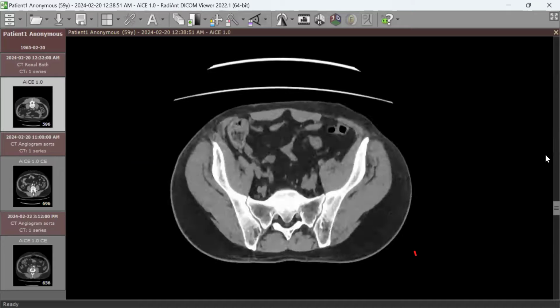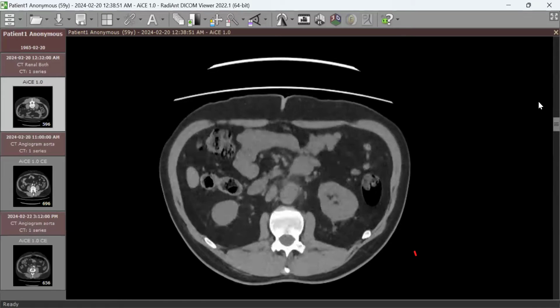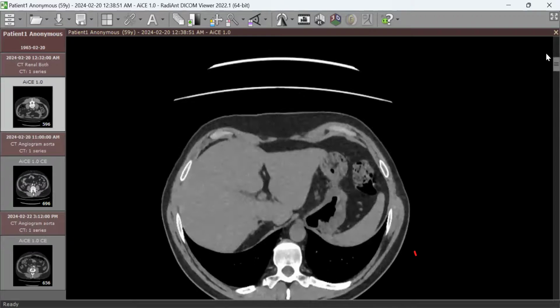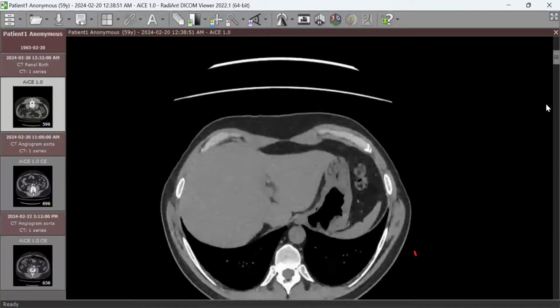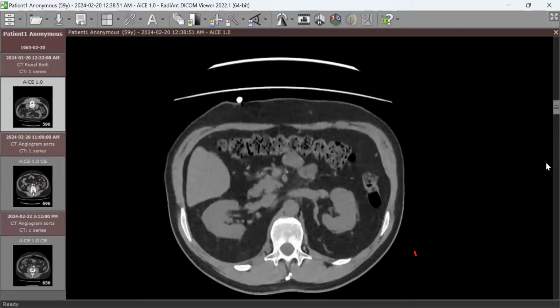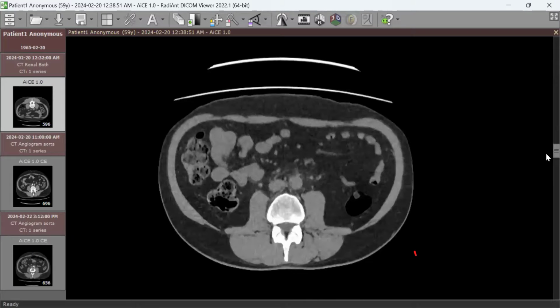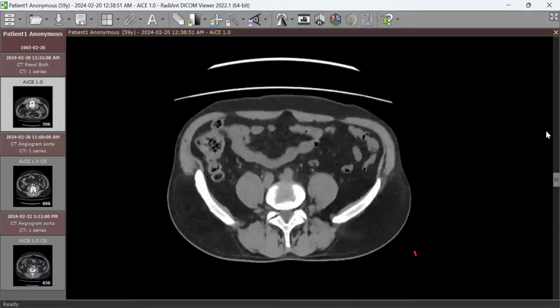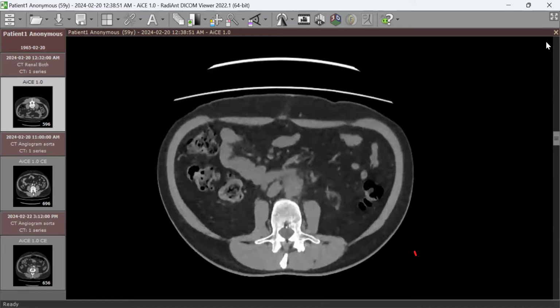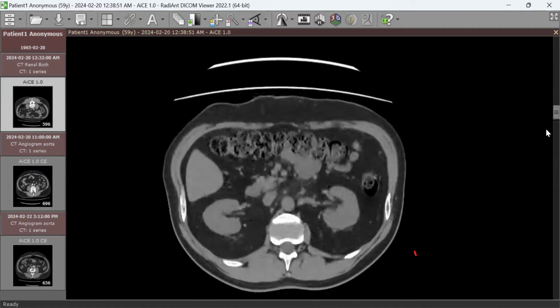What kind of a CT scan is this? This is an axial CT scan, native study. The history is right loin to groin pain for 1 week, and the patient had more pain today, so that's why he presented, and this scan was done for him.